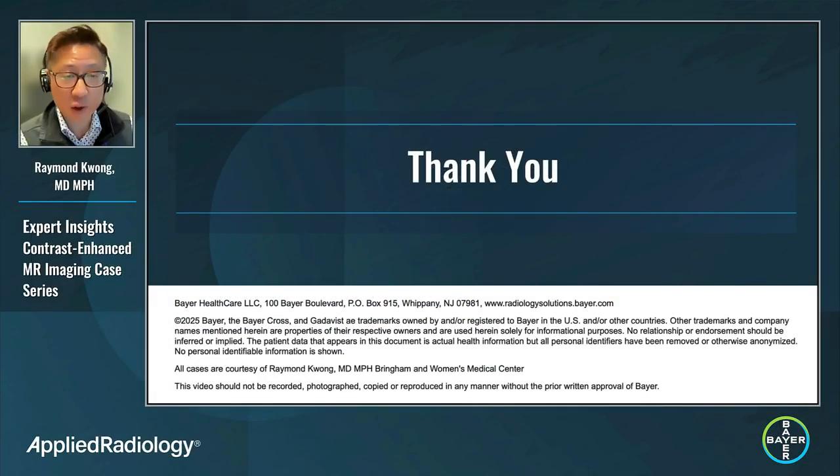I hope you find it useful to see how we use Gadavist imaging to assess stress and rest CMR myocardial perfusion and late gadolinium enhancement in adult patients who present with known or suspected coronary artery disease.